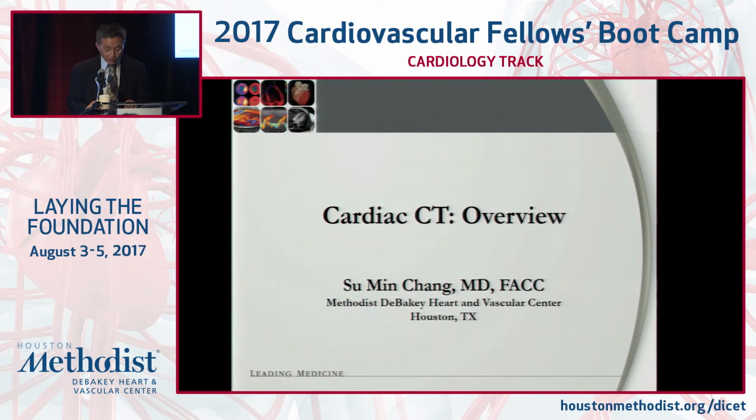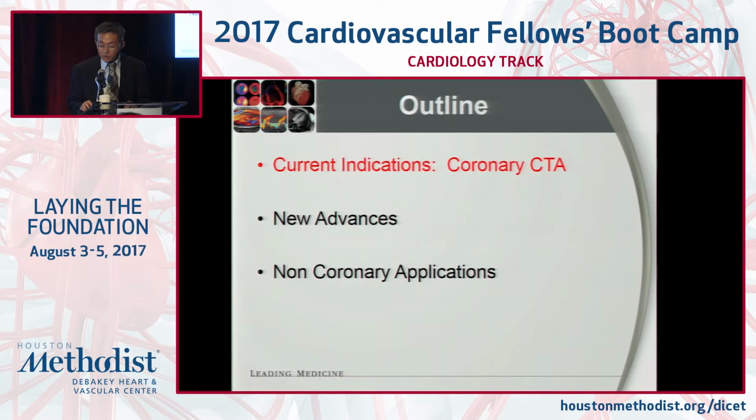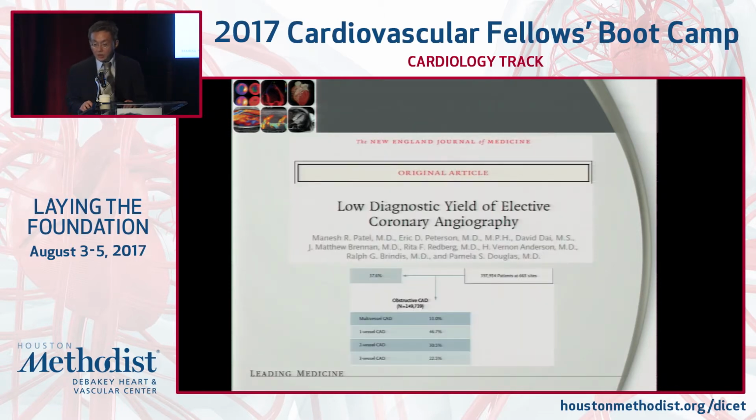So, a really quick overview. I'm not going to give you data or anything like that. I just want to show you examples, pictures, to impress you, hopefully, and give you some idea about the potential of CT. So, coronary indication. First, I'm going to talk about coronary CTA, which is the main indication for cardiac CT at this stage.